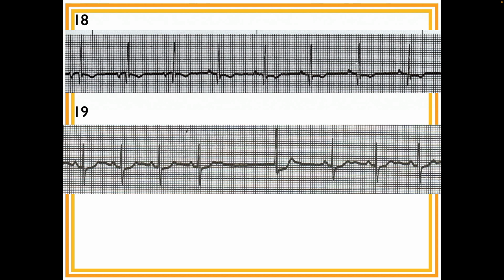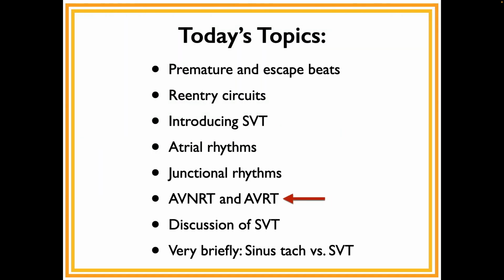I'm okay with that, but I don't require the pause, because the escape beat implies that there's a pause. So normal sinus with junctional escape. Okay, questions?